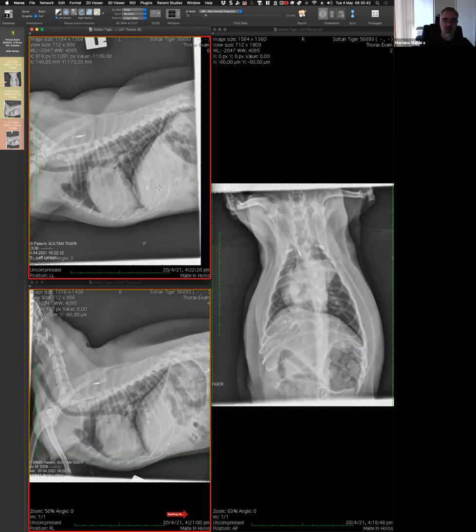You said there is increased sternal contact. You are saying that the shape of the heart is abnormal because there is kind of a reverse D. So this is the reverse D. You probably take Helen's comment saying, well, that's probably the pulmonary outflow tract. So that kind of fits. Then you have an issue with this in terms of the opacity. We can leave that aside for a minute. But then where you get in trouble is, if this is the left ventricle, then I have a hard time reconciling an enlargement of the left ventricle with an enlargement of the pulmonary outflow tract. And I would share that problem. I would not know how to put those together. Is there any way out?